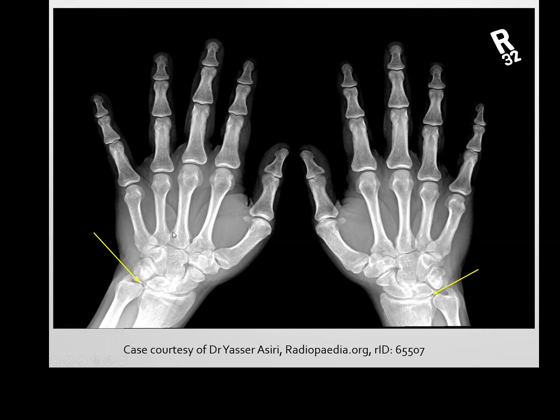So ignoring the fact that obviously there's great big yellow arrows telling you what's going on just here, in the grand scheme of things, it looks quite subtle on this patient, but if you look really closely, you can see again distal radius. You can really see that there's a very thin layer of calcium being deposited here between the lunate and the distal radius in particular, heading towards the syndesmosis between the radius and ulna. So that should give away signs just there.